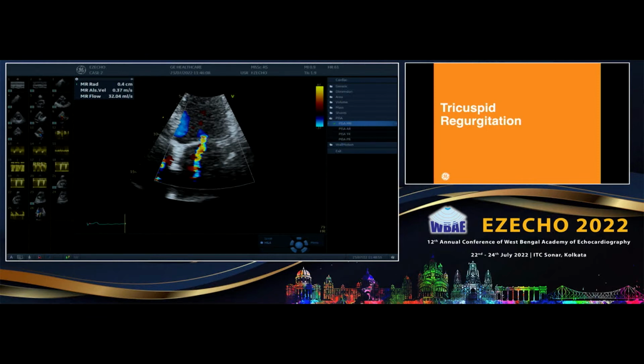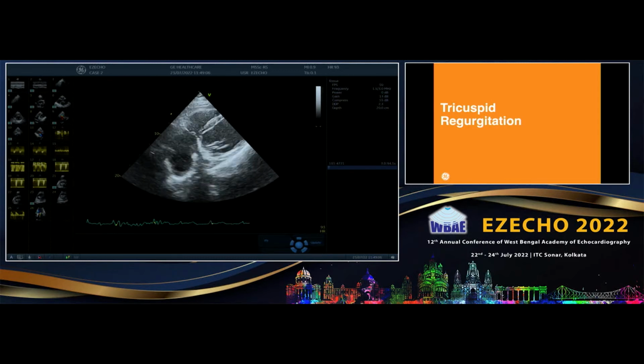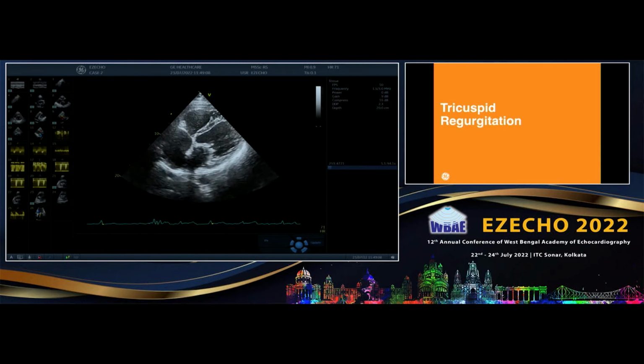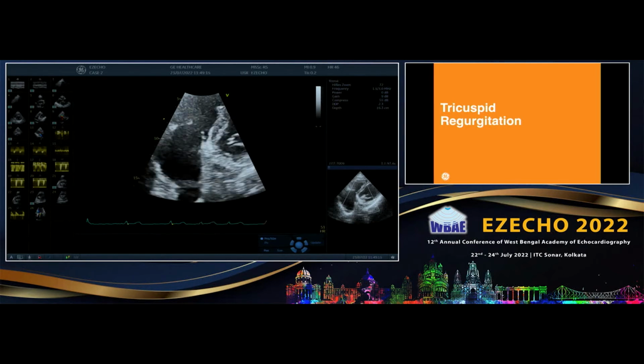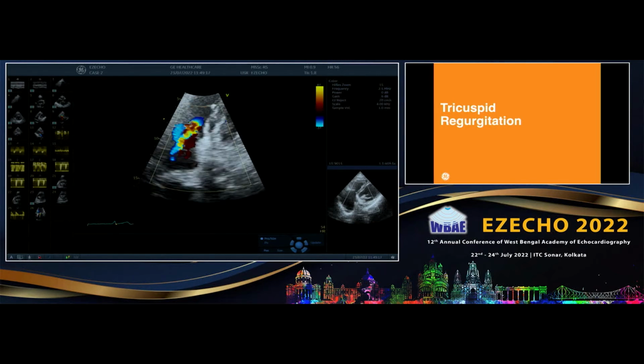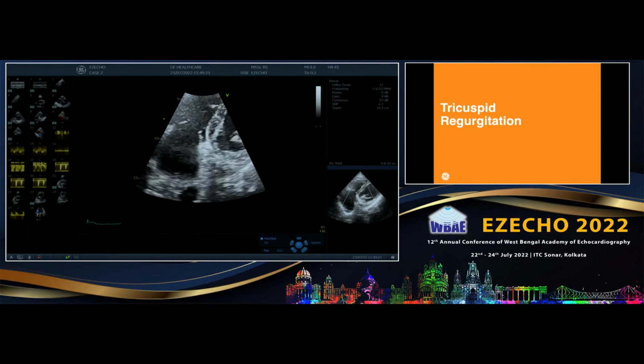Now, can I go to the tricuspid regurgitation, how to quantify the tricuspid a little bit, so that the valve assessment will be complete at this moment? I think he also has PR, and tricuspid valve thickness also. Yeah, so for TR you should always do the peak velocity, and unless you get a very good envelope, don't measure it. If he has tricuspid stenosis, just remove the color. How to quantify?